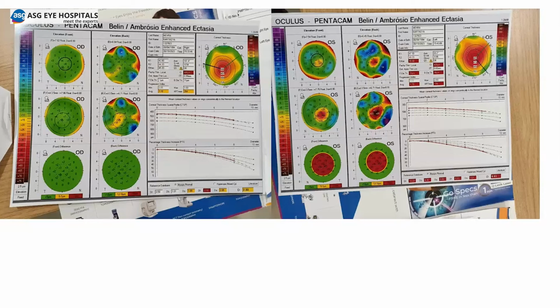Yeah, true. So it's a keratoconus suspect. I wouldn't label this as such. It would be labeled as an abnormal cornea to be followed up. Keratoconus suspect would be something that comes up frankly on these maps. When we see the D values, these are based on various values, and what we can do is repeat the maps maybe after 3 months and then conclude anything, especially if this kind of patient has to be planned for refractive surgery, and you are seeing that this is normal and this is abnormal. Would you plan a refractive surgery? We don't know, right? So we can't label it as keratoconus suspect, but we need to repeat the test, reassess, and then plan. Okay.